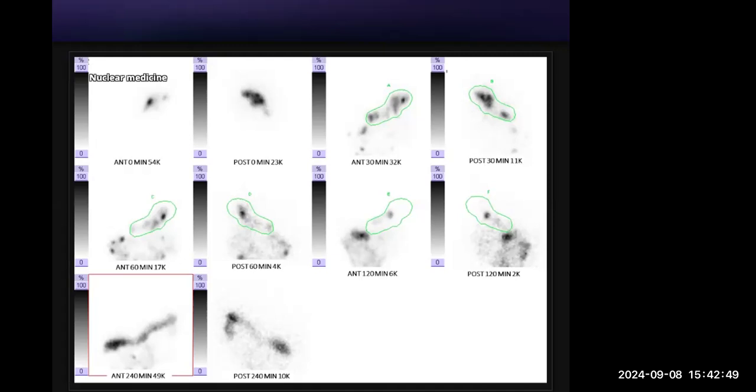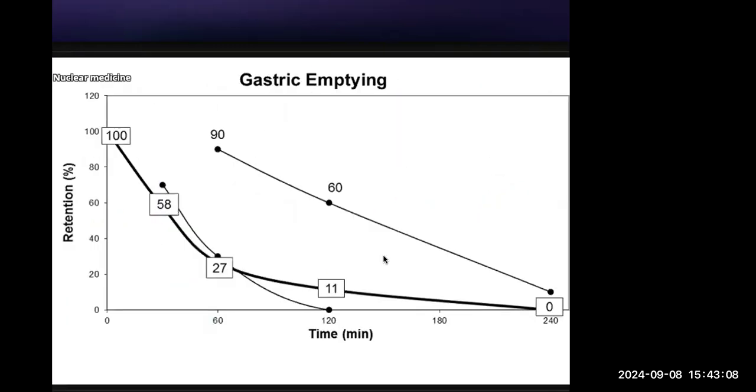The patient did not have any history of trauma or abdominal pain. The patient is diabetic. Okay. I have one more chart for you on the same case, if that can help you. Gastric emptying chart.